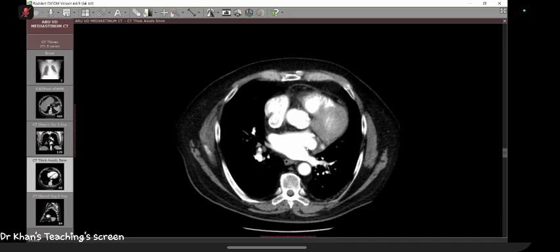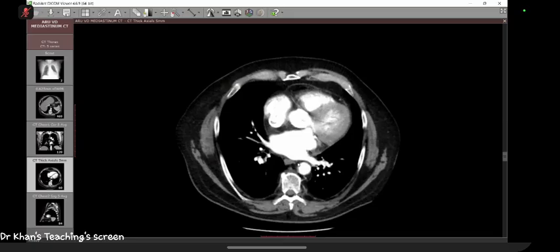But for you, this is another area where this structure is sitting here. For example, if an esophageal carcinoma is here, I will teach you signs of invasion of the pericardium on a CT scan. Now, if the pericardium is involved, it is still a T4 tumor; T4 is divided into T4A and T4B. So it is bad news, but still surgical. You can remove the pericardium and you can remove the tumor, right? So, areas of interest.